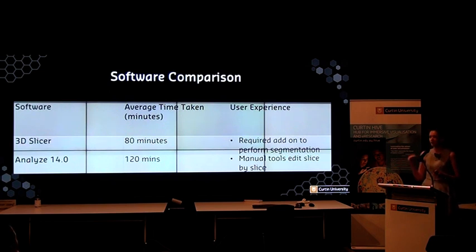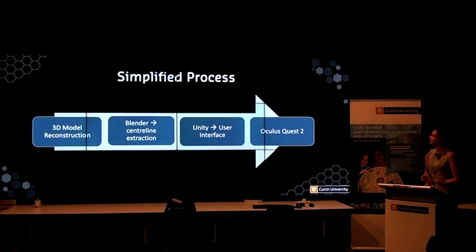And a lot of the manual tools edit slice by slice, which when you've got over 700 slices is quite a tedious process. So ultimately I decided 3D Slicer had a nicer user experience and it was performed in a quicker amount of time. So looking at if it was to be implemented into the clinical environment, it might be a better option.